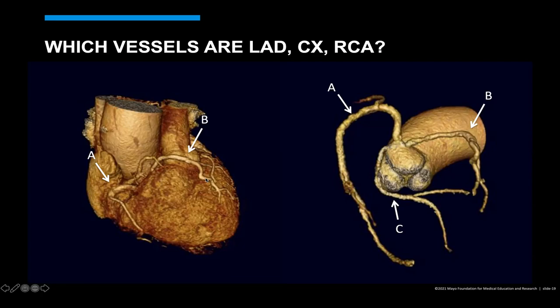And so, do you think that this is the cause of her chest pain? In other words, would this be considered a quote unquote malignant anomalous coronary artery course? No, the only one that's malignant is interarterial. If it's retroaortic or prepulmonic, those are usually not symptomatic. Yeah, exactly. Good. Thank you.